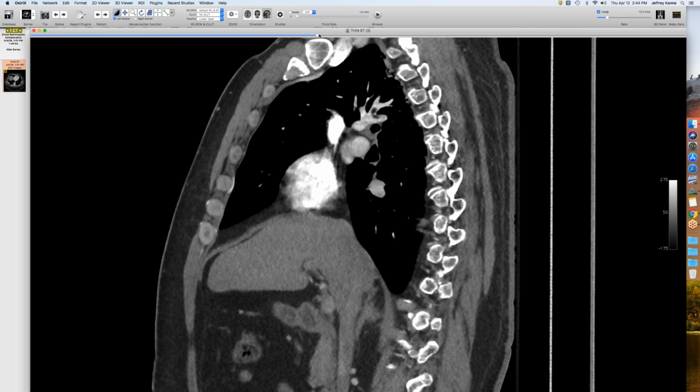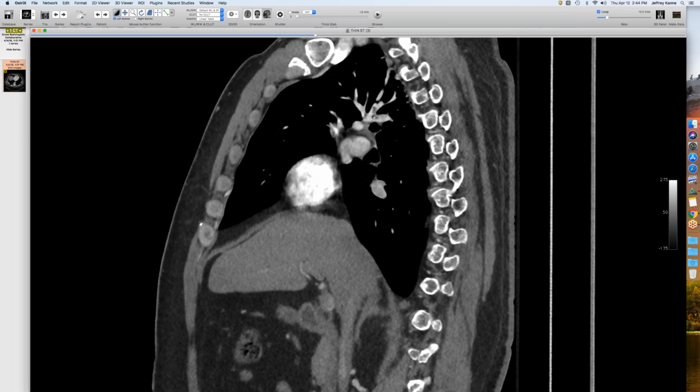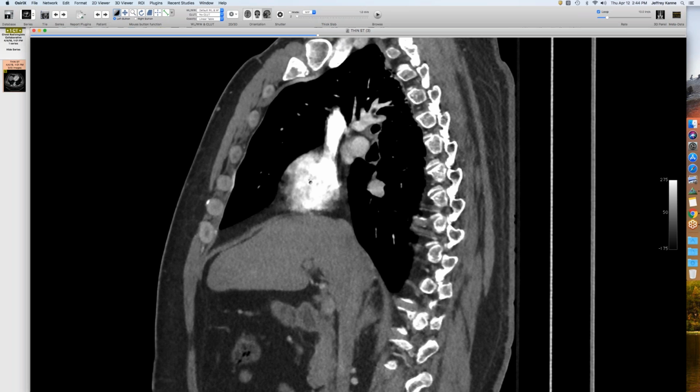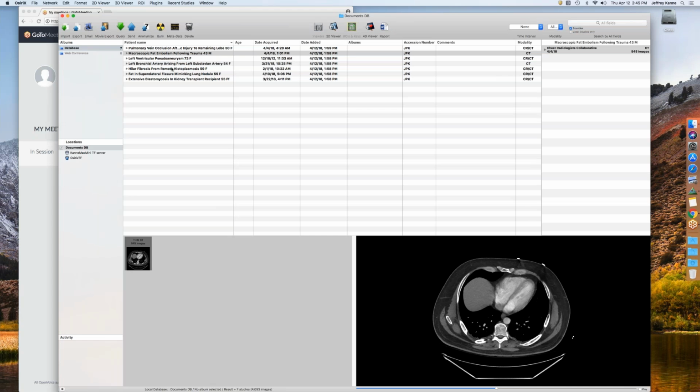No, this is the first one. I mean, it's been reported. Yeah, and sometimes we get streak artifact. But if you look at the images, it's a good quality. There's not any really artifact coming out there. And this is as dark as subcutaneous fat. You could repeat with a non-con and see that still. Yeah, maybe gone by. He never developed a fat embolism syndrome with an acute lung injury. That's really interesting. So it must have dislodged it somewhere and went flying. So yeah, that's one of those things you probably see once and never again.